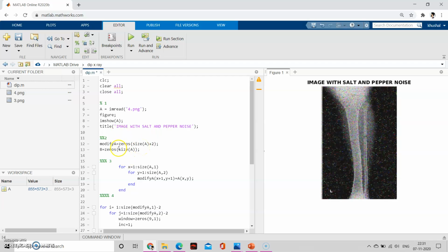In this second part, in these two lines, we are padding the matrix with zeros on all sides, like the column as well as the row side, or we can say left or right, upper and bottom. Not to confuse you, as we all know, X-ray is 2D imaging. So we are working on left and right, front and backward. There is no third axis involved.